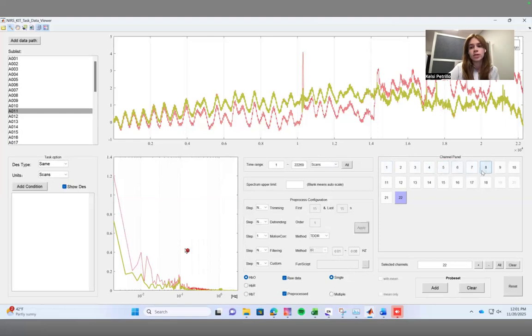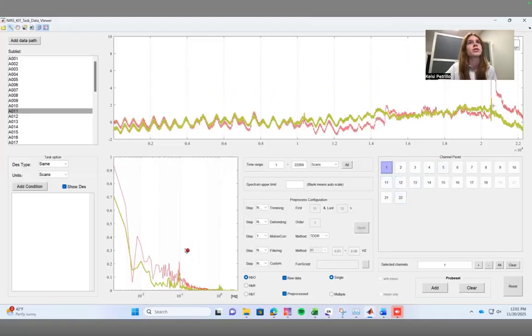So we're going to keep looking at the same subject that we just went through the channels for. If this is your very first time working with fNIRS data, you might not even know what a motion artifact in the data looks like. This channel has a fantastic example. Basically, when you're looking for motion, what you're really looking for is sharp spikes in the data, and those usually correspond to the participant doing some sort of quick movement with their head that affects the readings. Here's another great example of something that could most likely be a motion artifact. It's just a very sharp spike that doesn't really seem to follow the rest of the trend of the data.